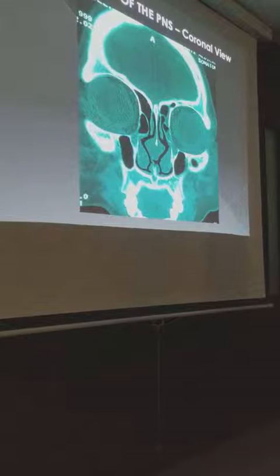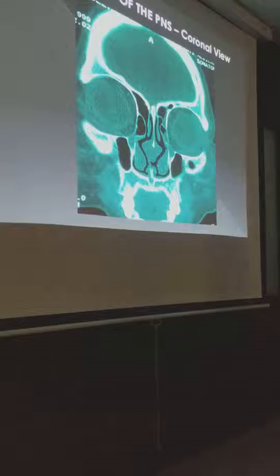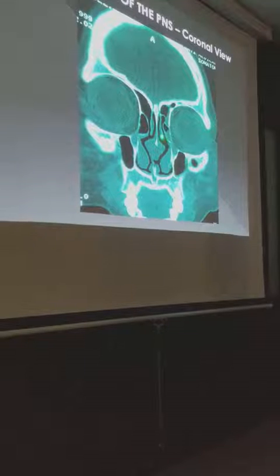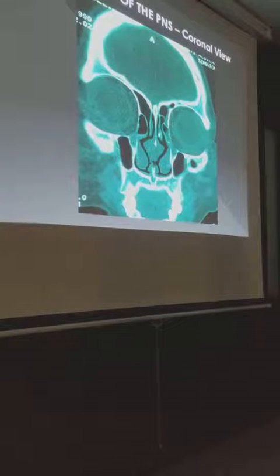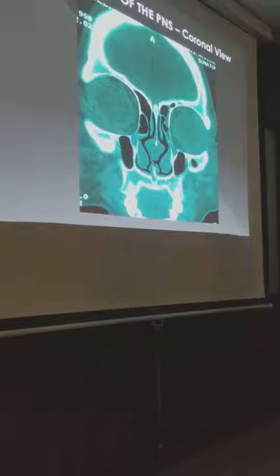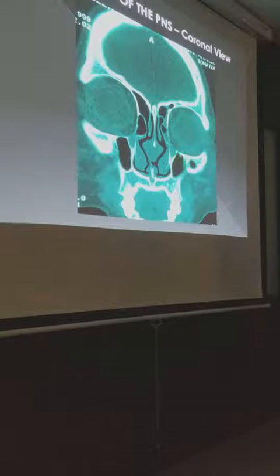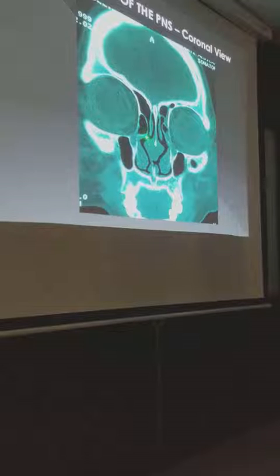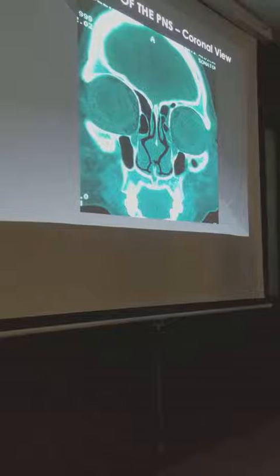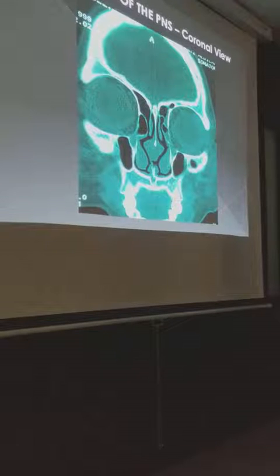Anterior cranial fossa, you've got your orbit here, middle turbinate, inferior turbinate, septal tubercle. What is this? Perpendicular plate of your ethmoid, alright. Maxillary crest, anterior nasal spine, right? Sinus is there, maxillary sinus. What is that cell?